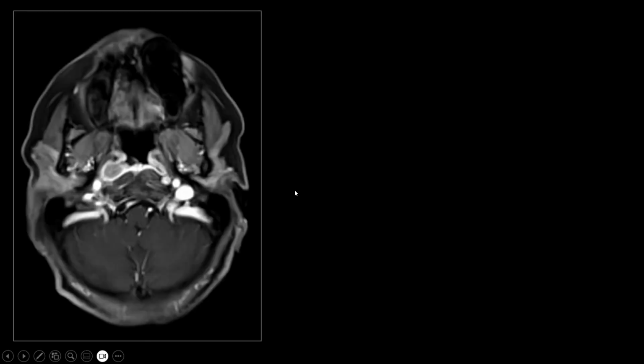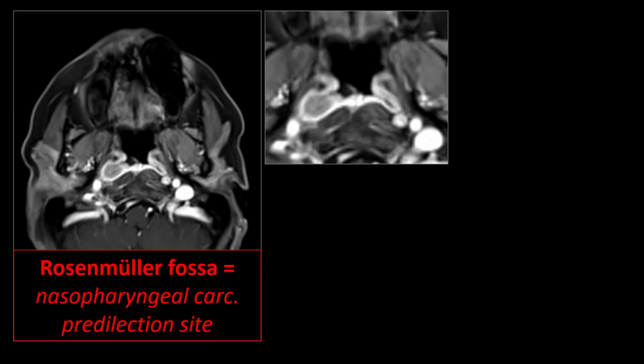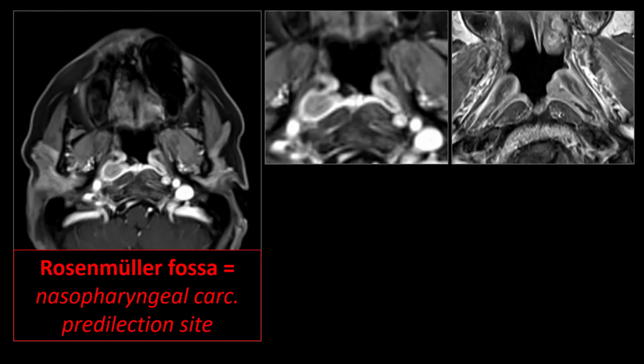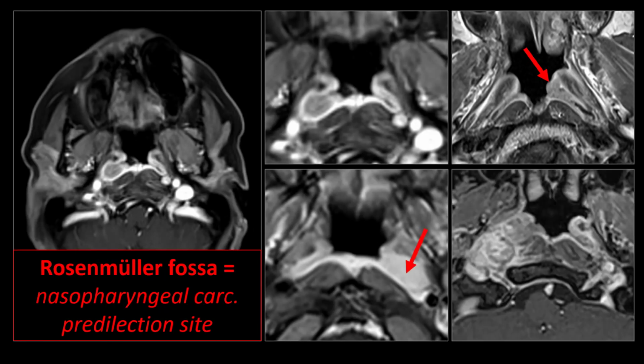Check the nasopharynx, and if you're looking for small tumors, check Rosenmüller's fossa, because this is the predilection site for the development of nasopharyngeal cancer. Here we see several magnified views of the nasopharynx, and we see small tumors located in Rosenmüller's fossa in each and every one of these patients. See them over here, and this is a large tumor which has infiltrated the prevertebral space. So we see infiltration of the longus colli muscles over here, and also of the parapharyngeal space.